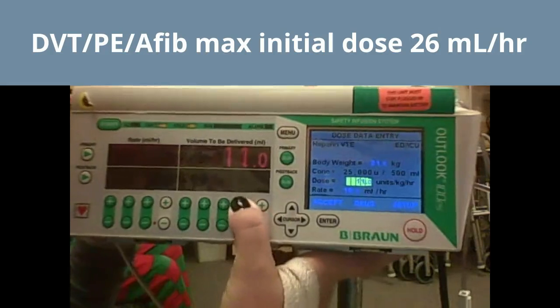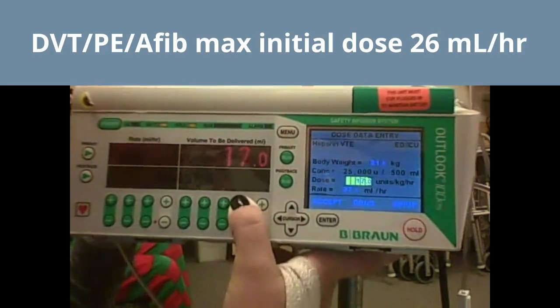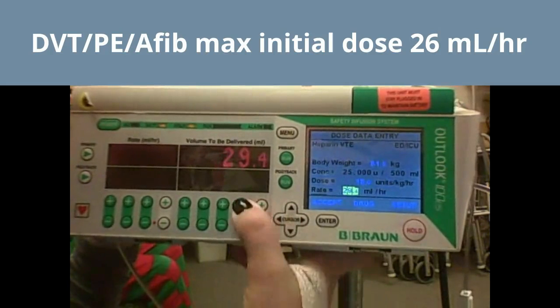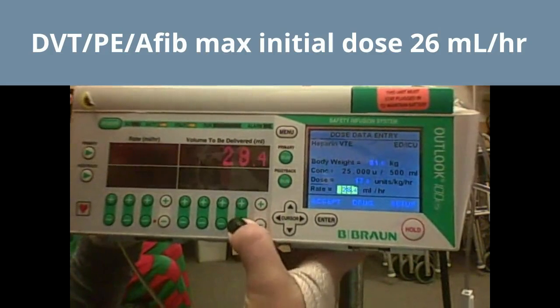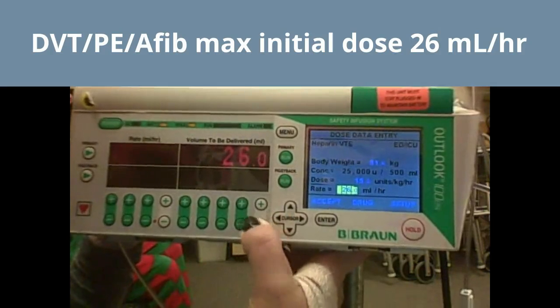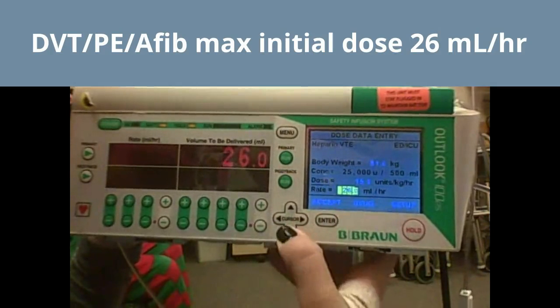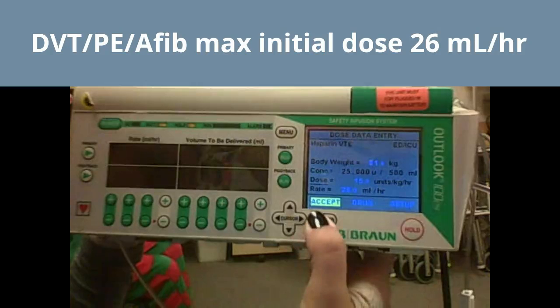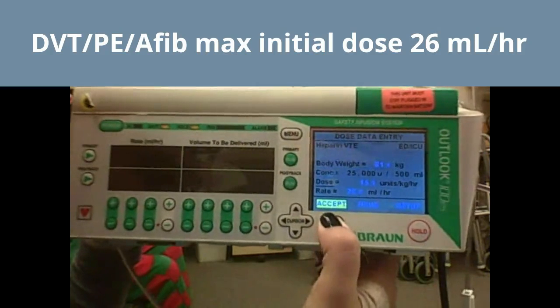The protocol is for 18 units per kg per hour, but we are going to max out at 26 mLs per hour for our initial dose, which changes your units to 15.9, and then you're going to accept.